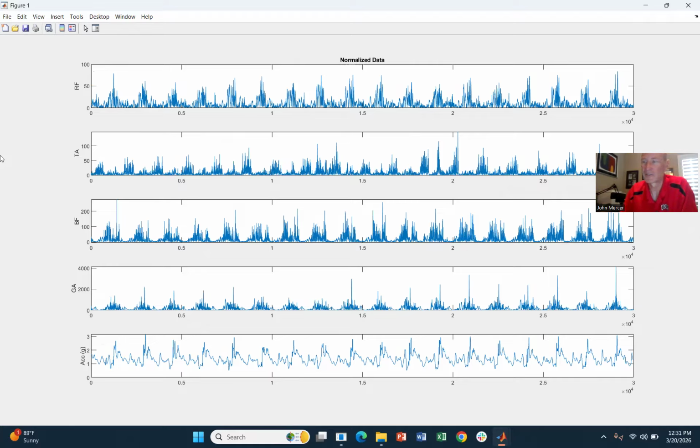I actually run my statistics through SPSS, but via Excel. And then I move on to the next condition. So that was subject 9, condition 1. This project actually had 6 conditions, but I'm only going to show 2 for the purposes of this video.